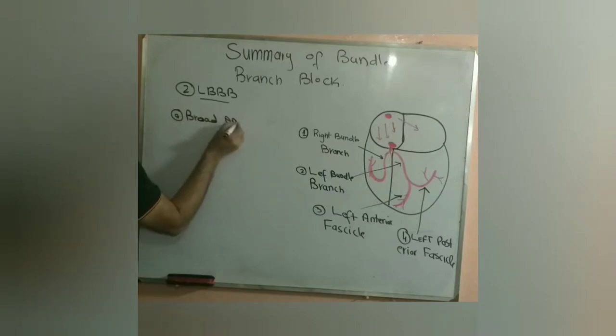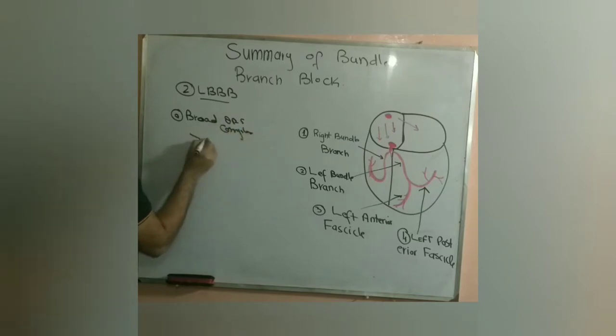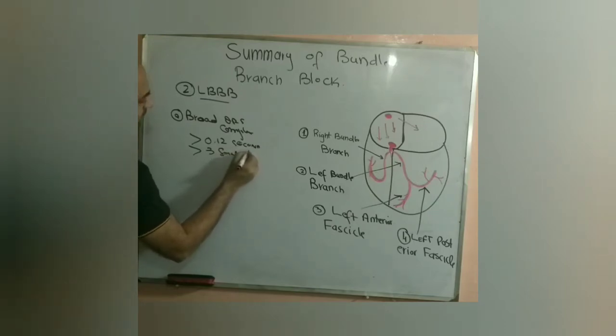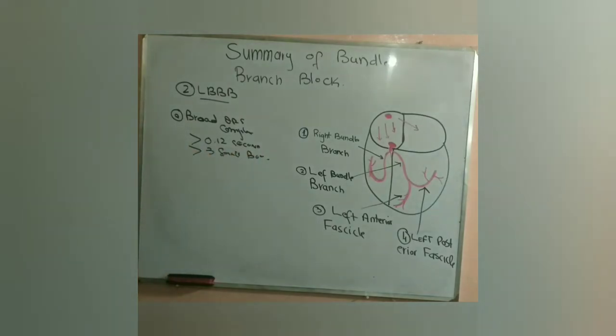QRS will be more than 0.12 second in duration or more than 3 small boxes in duration.